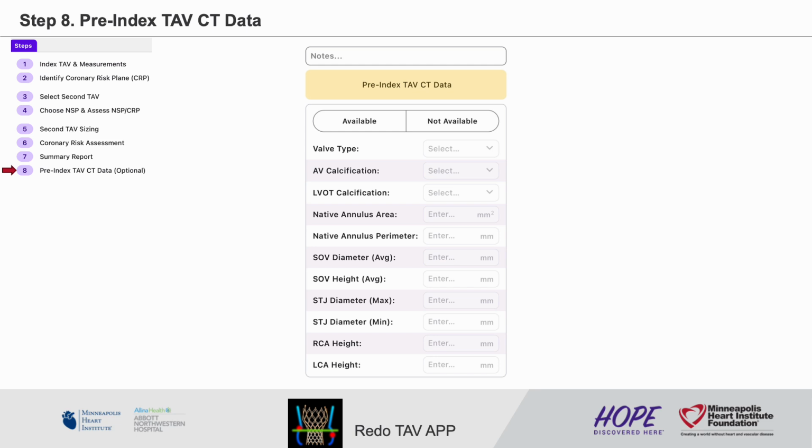This is all the steps for pre-procedure CT planning. I hope this video helps you with your planning. Thank you.